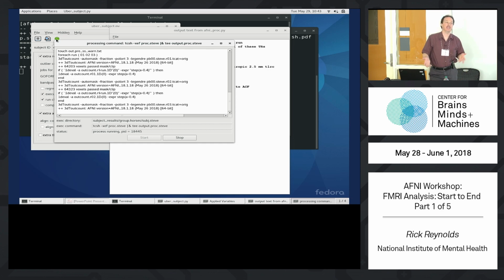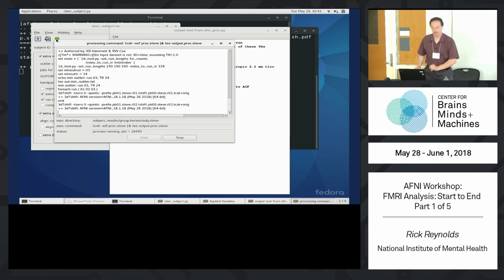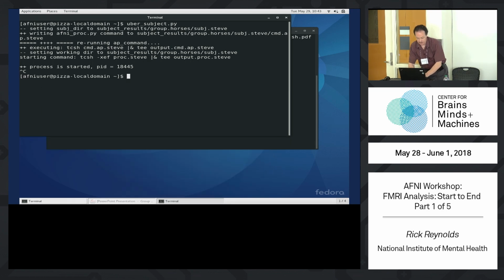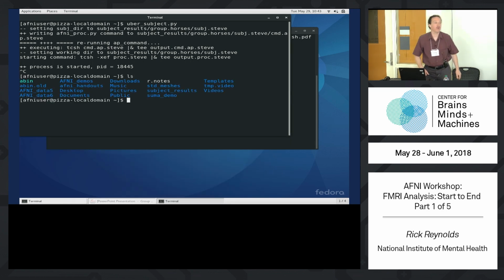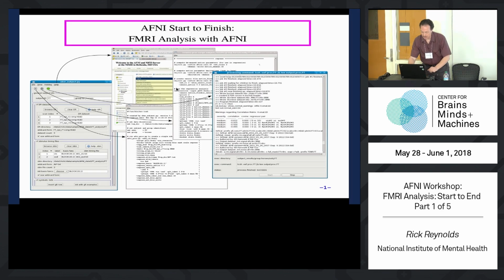And you can duplicate this basically for all your subjects if you want. But again, recommendation, don't do this. So I'm just going to trash this right here and now. It's dead. So what we'd rather you do is do this with afni_proc. We'll talk about that as we continue.